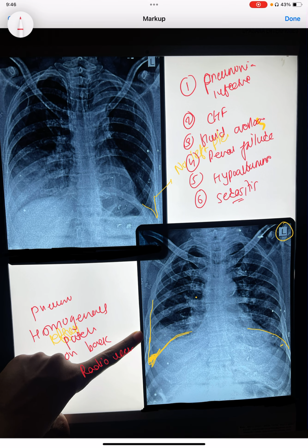So we know this blackishness, this radiolucency, is all normal lung parenchyma. So on this blackish or radiolucent finding, we have a homogeneous patch which is here in the right lower lung field. It is a homogeneous patch on the background of this normal looking radiolucent lung parenchyma. It is what is called pneumonia.